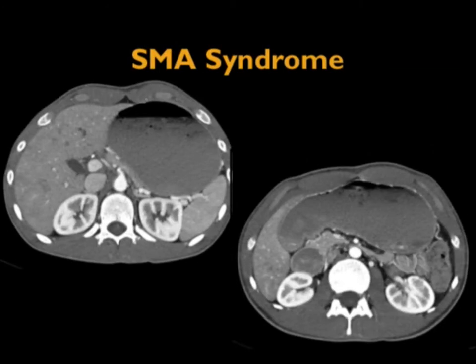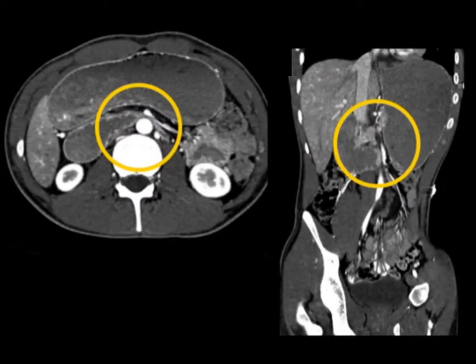The patient has nausea and vomiting. Question gastric ulcer, question cause for gastric outlet obstruction, question possible pancreatitis. The stomach is distended and there's food in the stomach, and you follow it down and now you see the duodenum is also distended. And you also then look and say, boy, that SMA angle, or the SMA distance rather, to aorta seems narrowed, as does the left renal vein.